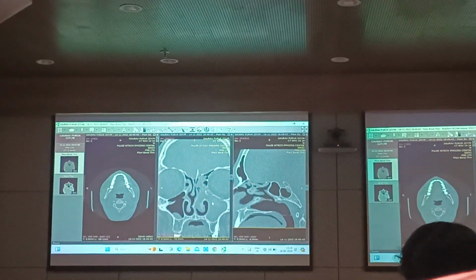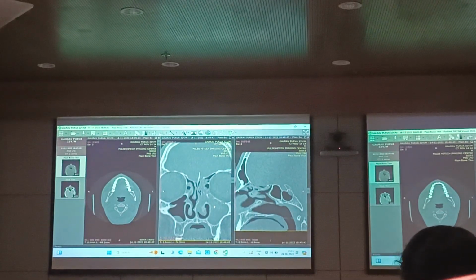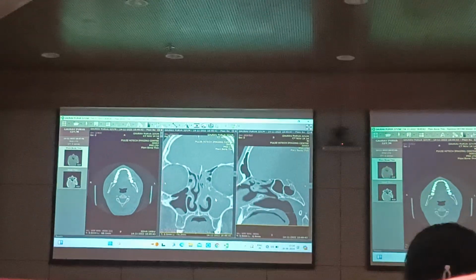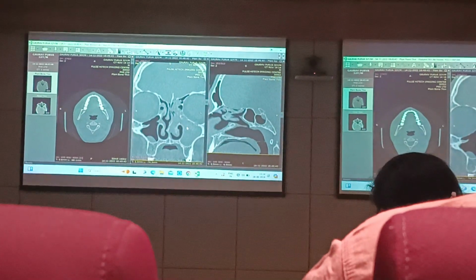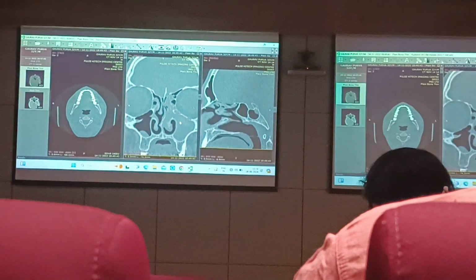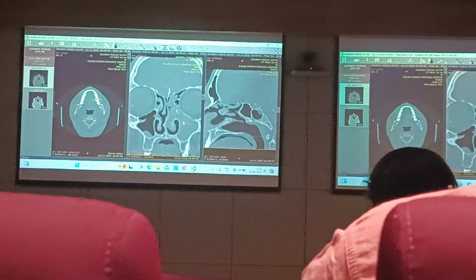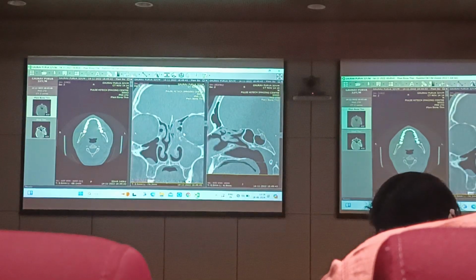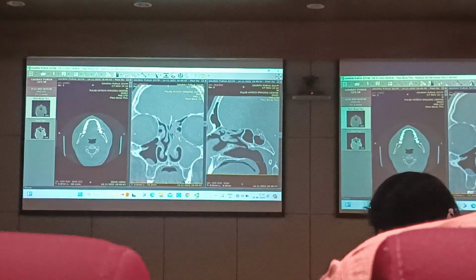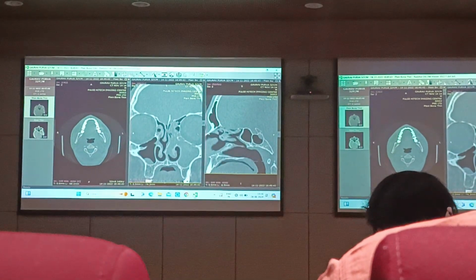Chronic rhinosinusitis with nasal polyposis. But the other side is quite clear. There's a little edematous ethmoid, that's all. Polyposis is generally bilateral. So you're looking at almost a unilateral disease, right? This is not a bilateral polyposis case. The rest of the nasal cavity is all clean, though you could still have a little haziness here.